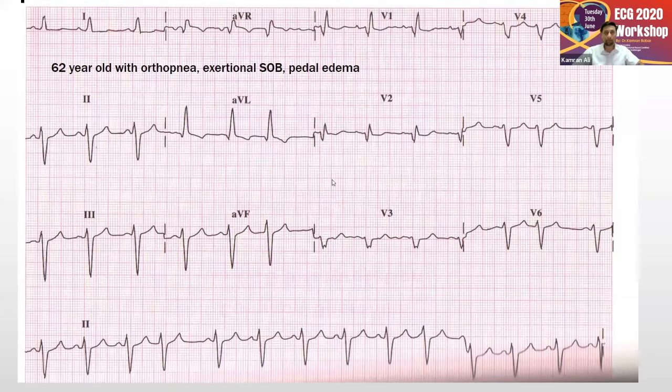Question number one, is it a sinus rhythm? Means do you see a P wave before each QRS? Anyone can answer on the chat box, and I'm gonna wait. So what are the P waves? Here's a P wave, there's a P wave before QRS, P wave before QRS, and the PR interval is not changing that much. But what you can see in the rhythm strip down there, there is a little bit of irregularity in the rhythm off and on.